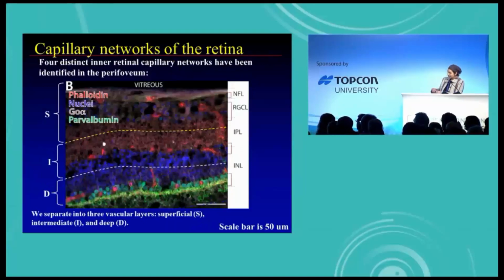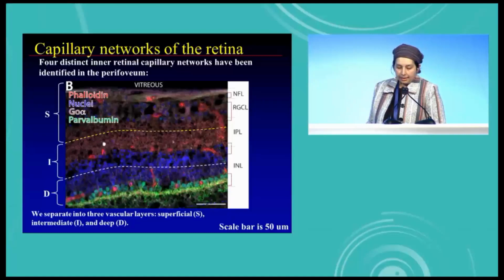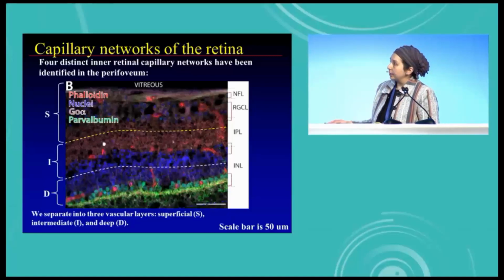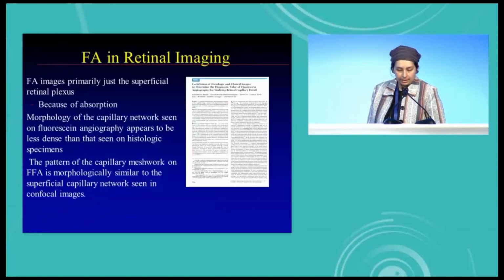Great. Okay. So you're looking at these remnants of the radial peripapillary capillary plexus, which Vas had mentioned, the plexus that extends out from the optic nerve. And then in the retinal ganglion cell layer, you have this superficial plexus. Generally, our OCT machines will collapse these two together, and these will become the superficial capillary plexus. Then you have an intermediate plexus that lies in the inner margins of the inner nuclear layer. And then you have the deep capillary plexus right here, in the outer margins of the inner nuclear layer. Often, the machines will collapse these two together as the deep capillary plexus.